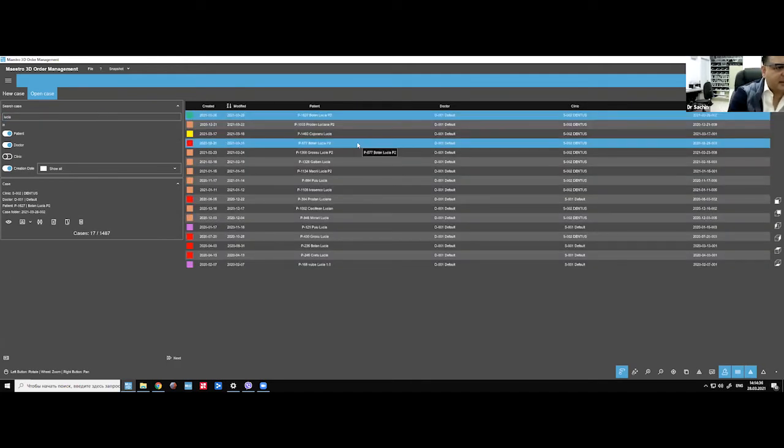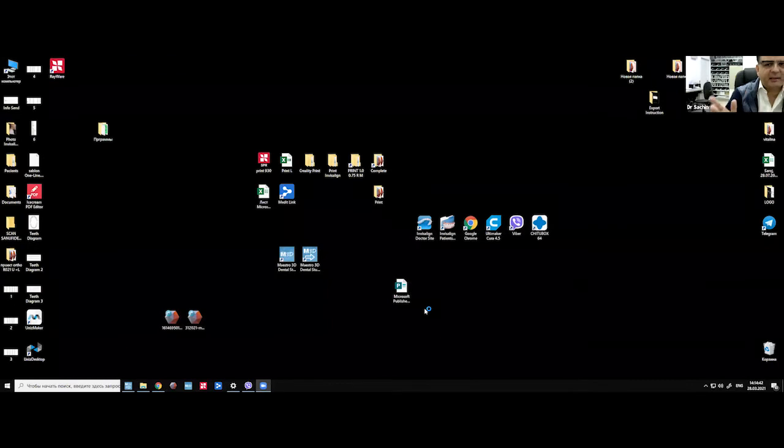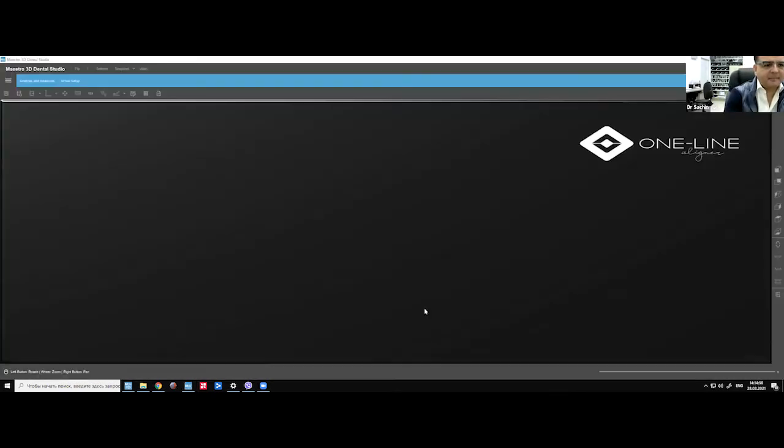So this is all the cases where we did refinement. So this is the first case. This is the first planning, and then also extraction case. This is working perfectly fine. I think I posted this case on the forum, the extraction case.